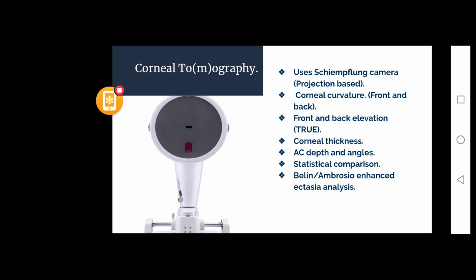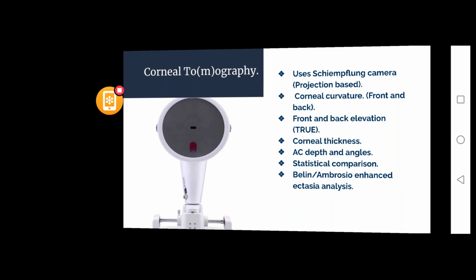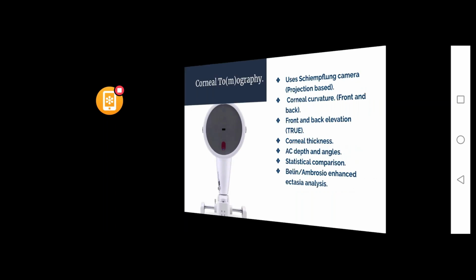If we have any scleral lens fitters over here, I bet you might have come across the term scleral topography. But because it's not our topic today, we won't be talking much about it. This is just for your information that such equipment is also available. Next would be the maps of topography, the colorful maps. Now, what do those mean? What are the shapes of it? How do those appear? What do those colors mean? We'll be talking about all those things.